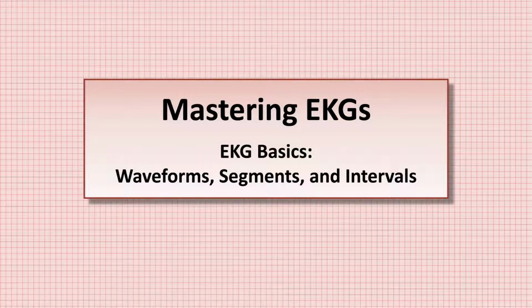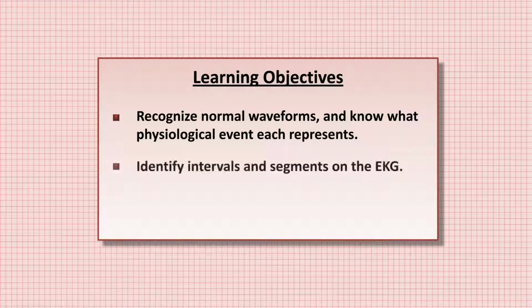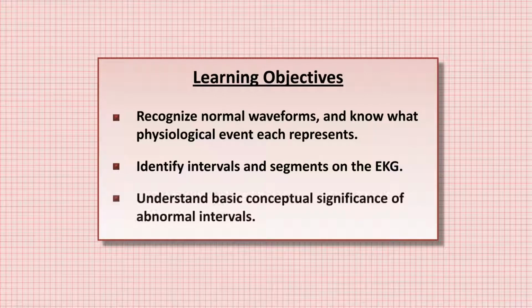Hello. Today's lecture on EKG basics will cover waveforms, segments, and intervals. The learning objectives are to recognize normal waveforms and know what physiological event each represents, to identify intervals and segments on the EKG, and to understand basic conceptual significance of abnormal intervals.